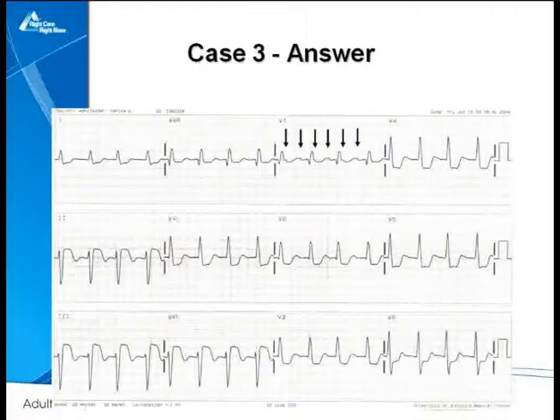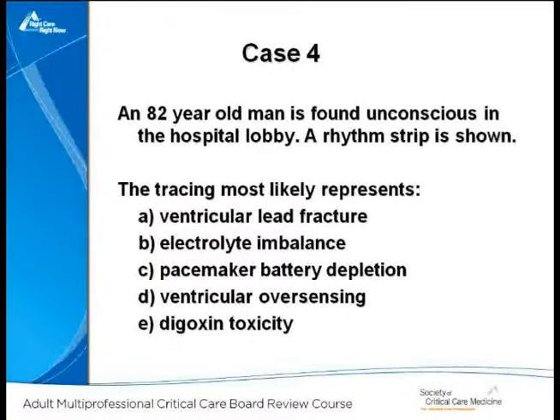And the history, somebody who's doing well, now has a tachycardia or a faster heart rate, isn't doing well, should make you think that this is some sort of atrial arrhythmia because of the history. So that may be the first time I've ever had the lowest percentage be the right answer. But okay, I told you I wasn't going to be popular after these.